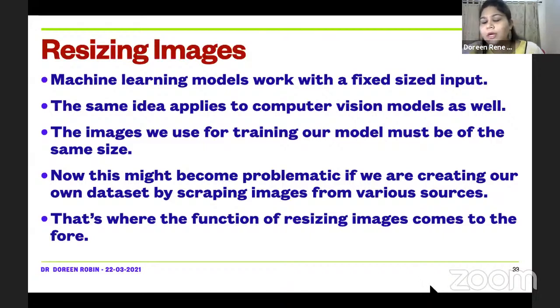Okay. We started working with how to take the data using OpenCV. First step, we mounted our Google Drive. We had an image in Google Drive, all right. And then we loaded the image from the Google Drive into Colab. Then we did the color changes from BGR to RGB, and then we stored it right back. Whenever you get output in your image analytics, used for healthcare or any sector, you need to store it back. That is what we have completed.